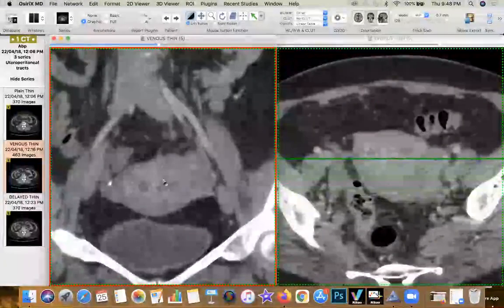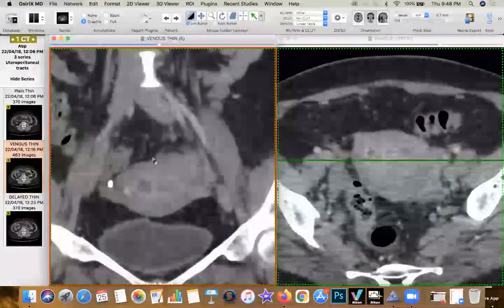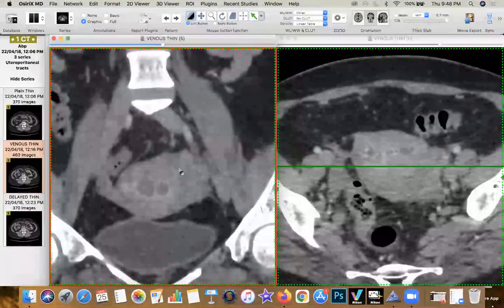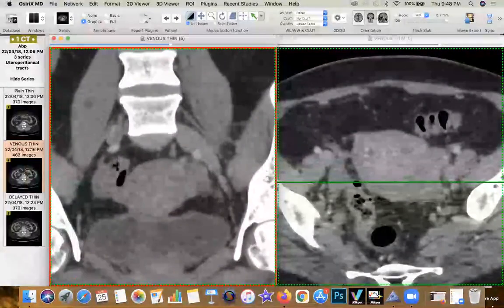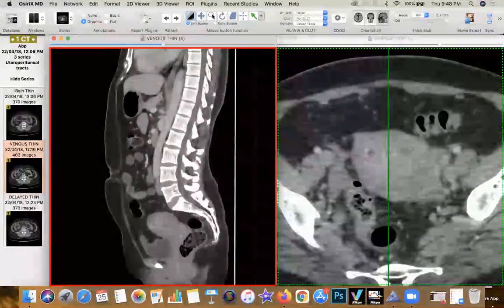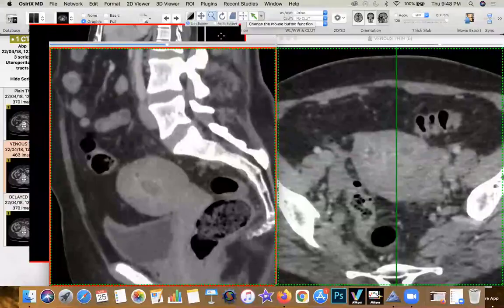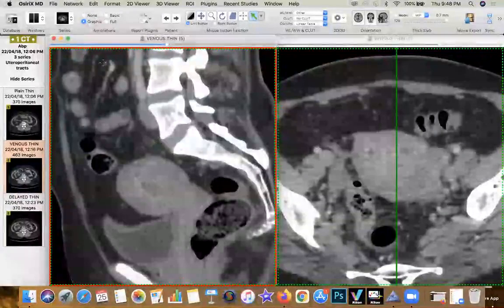You get these linear strands which are running up, and they're radiating outwardly into that fat. And what you have here is the rectum sitting up here, and you have all these kind of linear twigs or these linear strands of enhancement or hypoenhancement radiating from the corpus surface. So I'll put this back on the sagittal plane, and you'll see this again. Corpus, which is normal in size, probably slightly bulky, and you appreciate these linear strands which are coming up here. So that's the imaging appearance on CT.